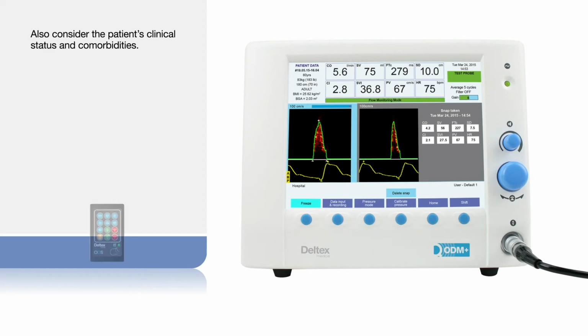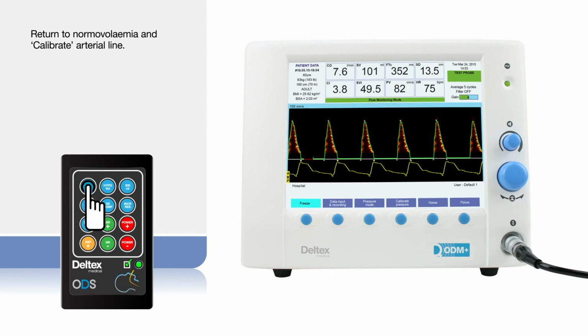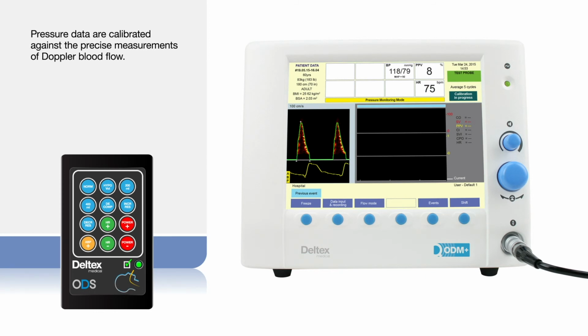Let's change back to normovolemia and initialize data from the arterial line. Simply press Calibrate Pressure. This calibrates pressure against the precise measurement of Doppler blood flow.